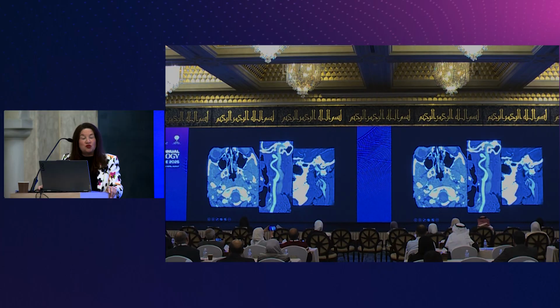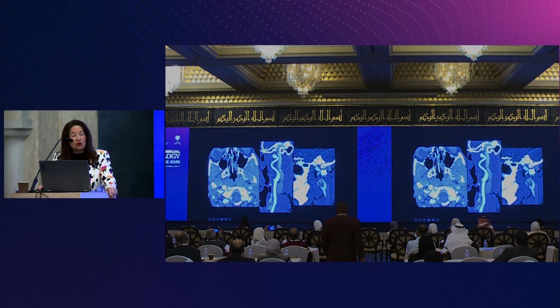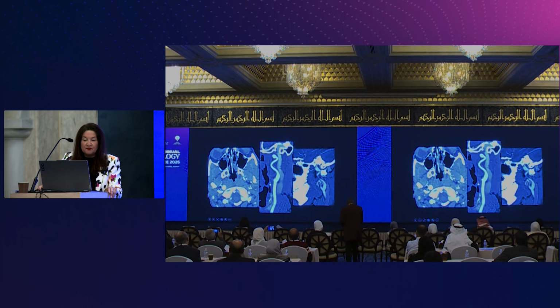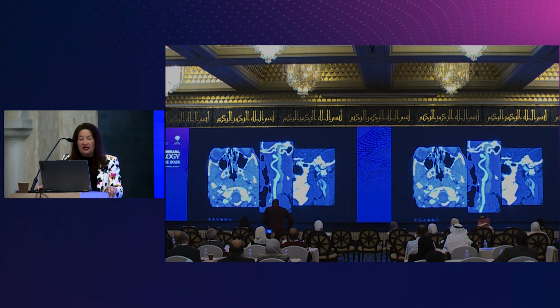Here's another pseudoaneurysm. This was an aneurysm here in somebody that had bilateral internal carotid artery dissections. They occur most commonly at the skull base. And you'll see how large the carotid artery is here. And if you're astute, you'll see on the other side, it's very hard to find the carotid artery. That's because it's dissected. This is the CTA reconstruction showing the dissection and the pseudoaneurysm coming from the right internal carotid artery.